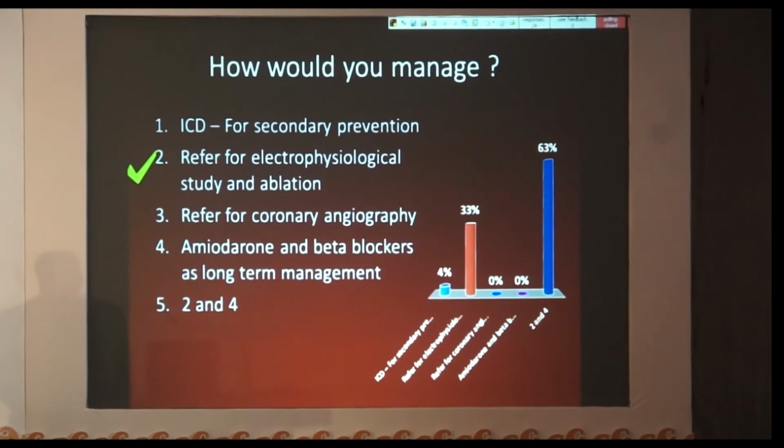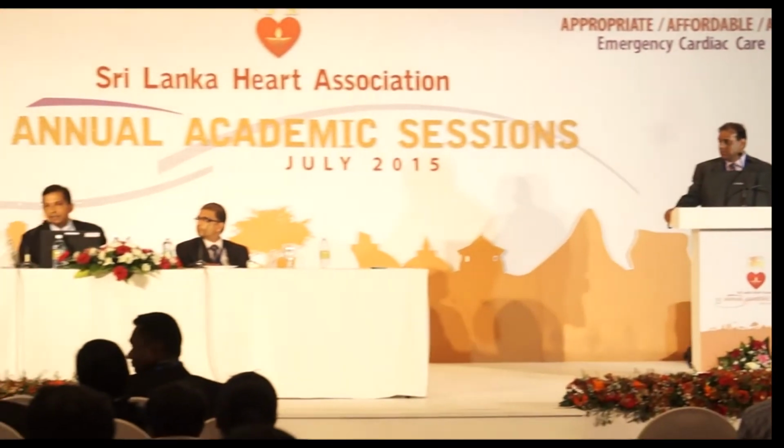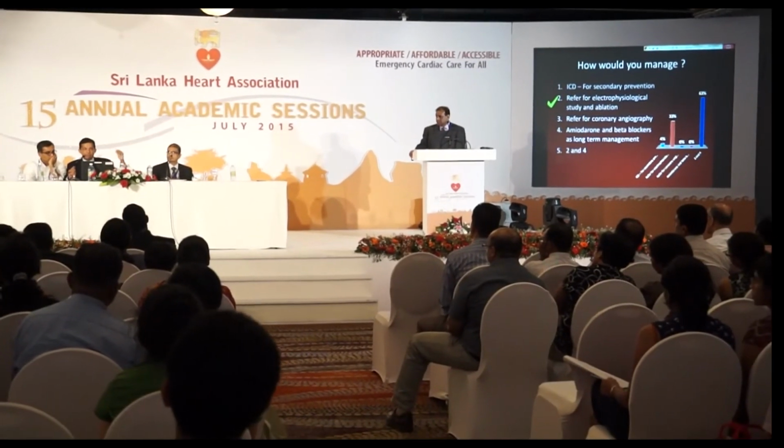Want to invite to come in? We being electrophysiologists, we derive pleasure in slicing and dicing the EKG, but I totally take the point of Dr. Gunawardena. Don't get carried away by some of the comments we make on the complexities of the cases. The teaching point here is that if you have a patient with wide complex tachycardia, unstable, synchronized cardioversion, that's number one. And number two, if you have an antidromic pathway, which is capable of going down through the pathway, because some pathways are only unidirectional, either go down only or go up. But when it goes down, the problem is this.